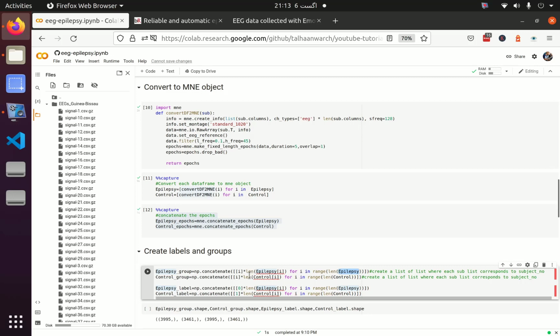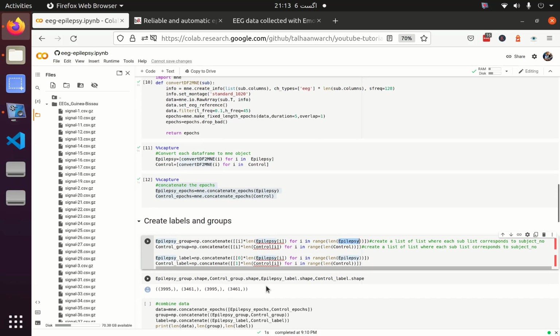So actually I am creating a list of lists here. The first list in the list of lists is 0, the second list is 1, the third list is 2. So I hope it is clear. If it's not clear, I would recommend you watch the previous tutorial where we have done this maybe in a different way. After the list has been created, I'm going to concatenate it, which actually converts the list of lists into a NumPy array.